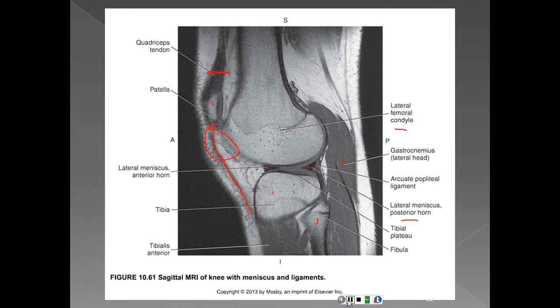Well, the internal ligaments, page 695, internal ligaments would be the cruciate, cross shape. Cruciate is just another way of saying a cross. So the anterior and posterior ligaments are a strong band of fibers that provide anterior and posterior stability to the knee. So the anterior cruciate ligament, or the ACL, arises from the medial intercondylar tubercle and extends to attach to the posteromedial surface of the lateral femoral condyle.